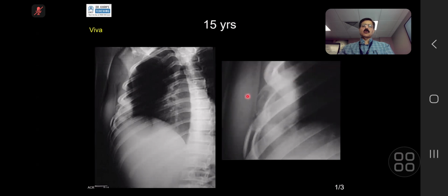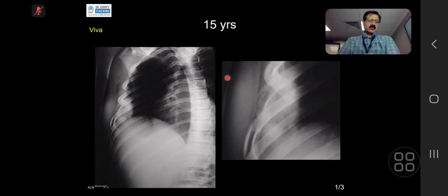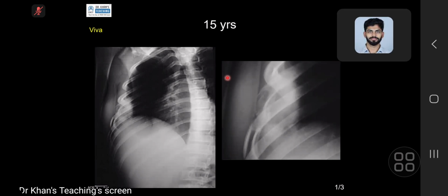Describe this lesion in this rib. Over to you. I'm provided frontal and lateral projection views of the right side of the chest, showing an ill-defined lytic lesion involving the anterior aspect of the sixth rib on the right side, with a small area of sclerosis in the central aspect, and a wide zone of transition.